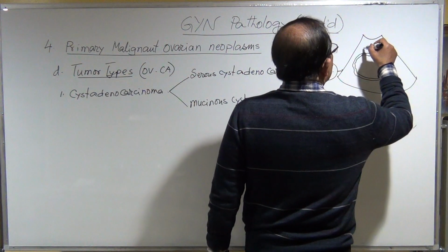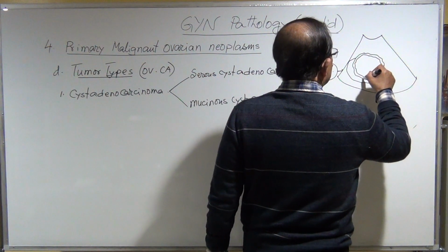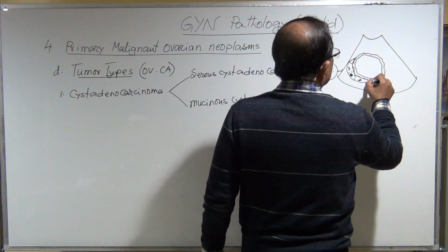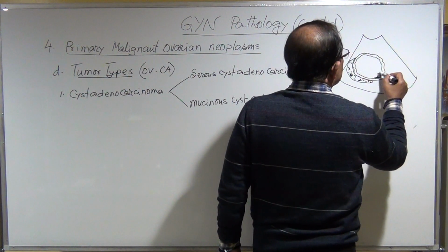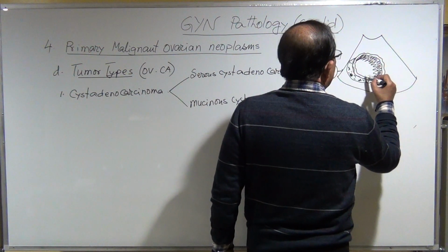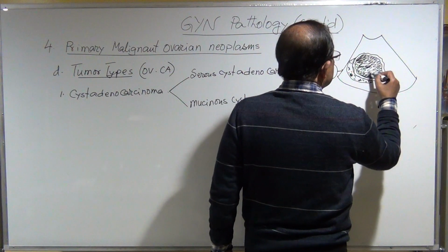Okay, and this is all cancer cysts that found in the ovary, that wall is thicker.